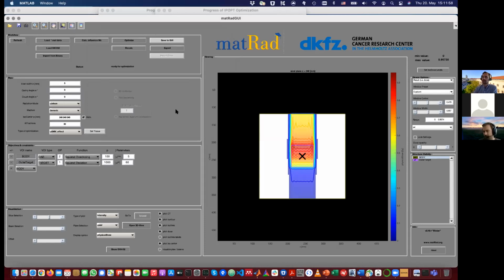But we already did this upfront once and have also tabulated these depth-dependent dose-averaged alpha and beta curves for each initial beam energy. So we can directly start treatment planning for this new tissue type.